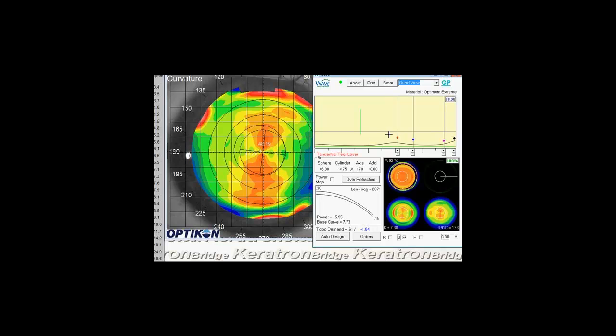Next thing we're going to move is the optic zone, which is this red dot here. Right now Wave has it set at 6.2. That's just by default. It came up as one value. We changed the diameter, so it shifts around a little bit.